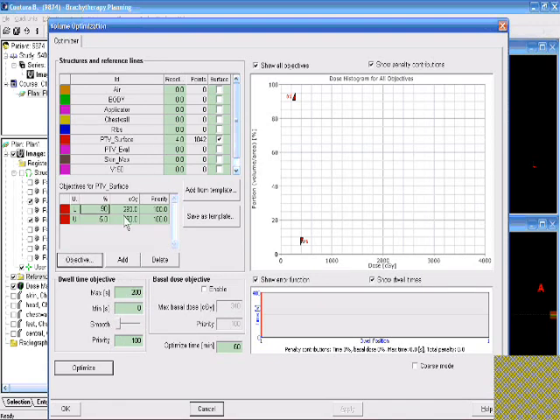And we'll want the lower to be 95% dose, excuse me. And the upper one we can leave about where it is for the PTV eval. We just actually need a lower one now. So we'll just add one, change it to lower by typing in lower. And we want 95% here, 95% of the dose. And we'll set that at 100% priority.